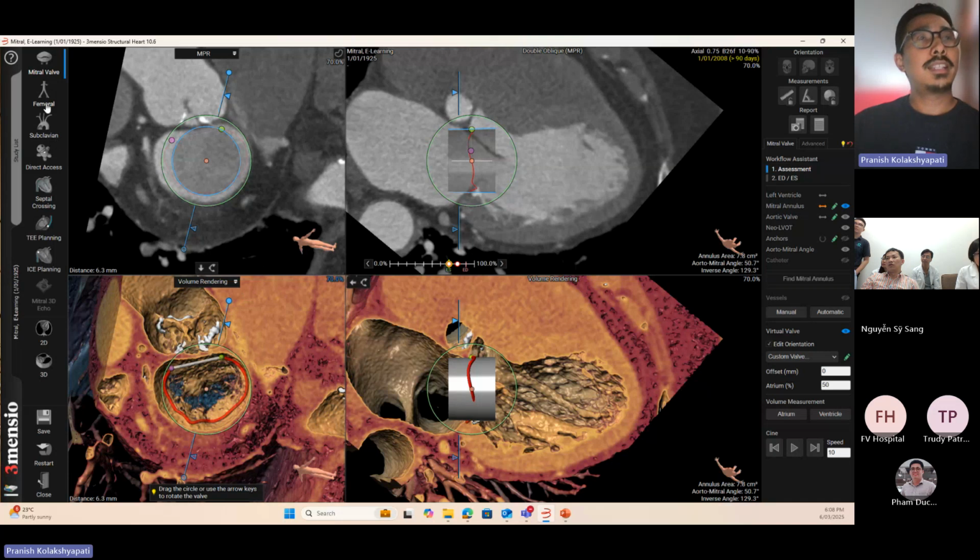So the femoral planning is similar to what the aortic planning was yesterday. So I'll not go through the femoral planning. I can go to the septal crossing. So how you go from your IVC to your septum, you can plan that.